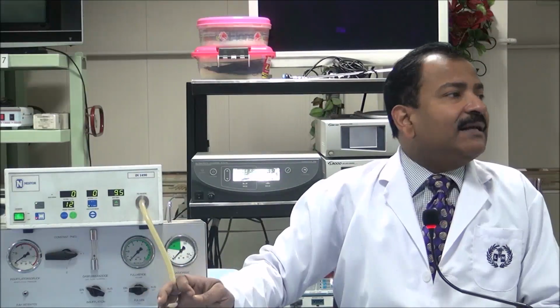What are the variables? One is the height and the size of the patient. One patient is only 4 feet tall, another patient is 6.5 feet tall. So, of course, the taller patient will take more gas. Another variable is muscle relaxant. One patient you are doing under epidural or spinal anesthesia or local anesthesia, then you cannot give muscle relaxant. Patient is tight. So, with less gas only, the 12 millimeter mercury pressure will be achieved.